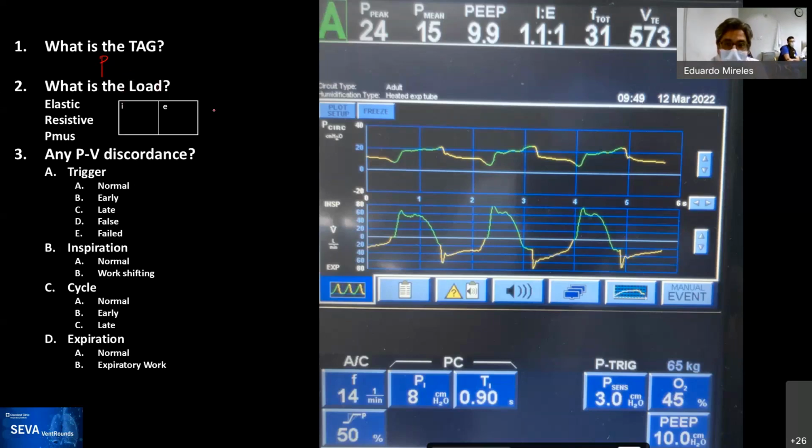I don't see a color change precisely, so most of the breaths appear to be machine triggered. Definitely. Don't see any breath to breath variation. Second wave has some flow variation. For the most part it looks like set points. I will say PCC.